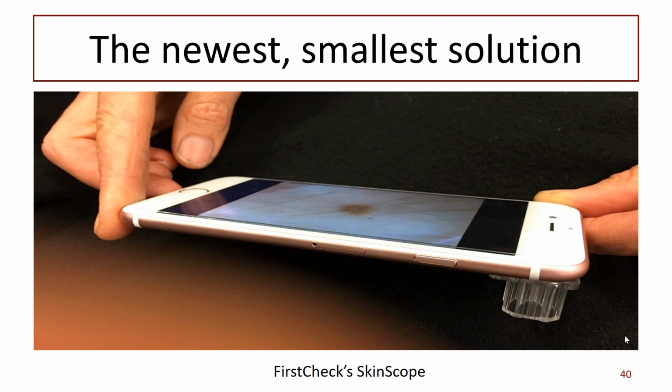Now the newest, smallest solution from First Check is a skin scope that is tiny, easy to lose, doesn't have a light, doesn't have a battery. Good. If you don't have a battery, it can't go flat. But you need a lot of light to use it. It's not polarized. It must be used in contact, and it's extremely small. So don't expect the results to be the same as what you can get with a larger, more expensive device, but it may be adequate.